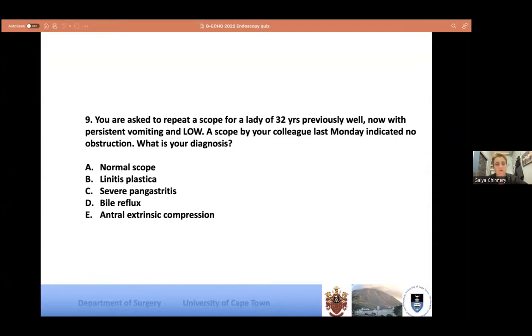Or B, this is potential linitis plastica, or severe pangastritis, or bile reflux, or you think there's an element of antral extrinsic compression. Why don't you put the poll up for us? Thank you. Okay, let's see. Yes, okay. Thank you to everybody who answered B.